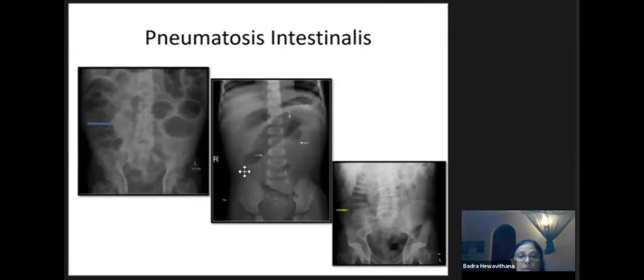You may not see a large one; the patient will not be lucky, but you should be lucky. These things are staring at you, but at times you have to stare at the pictures and look for it. You can see a tiny linear translucency in the bowel wall, and there's a small pocket of gas. This may be even perforation or maybe pneumatosis. Triangular air shadow here. This is either pneumatosis or maybe even a small pocket which has leaked out.